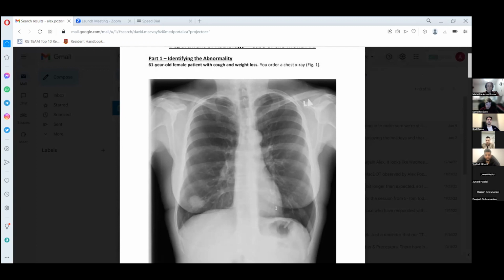And an important thing to note is that on all of the radiographs, it's going to be very confusing because the left and the right are kind of counterintuitive. So you always have to be mindful when you say right and left on the radiograph, and same thing on the CT. And it's okay if you mix it up. Like everyone mixes it up from time to time. I forget about it. It also gets really confusing in real life when you're giving directions to someone and you're still in your radiological mindset and you're mixing up the directions. So that becomes sometimes really tricky.